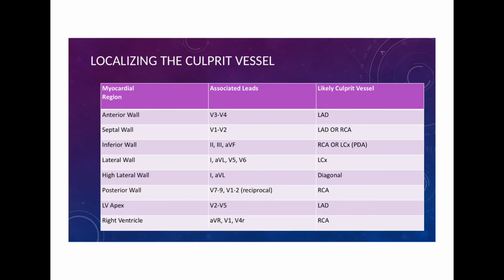Again, it's very important to keep in mind ECG lead anatomy, because you can really use this to identify the location of the infarct, and many cardiologists will look at the ECG to help identify where they should start looking for a blockage.